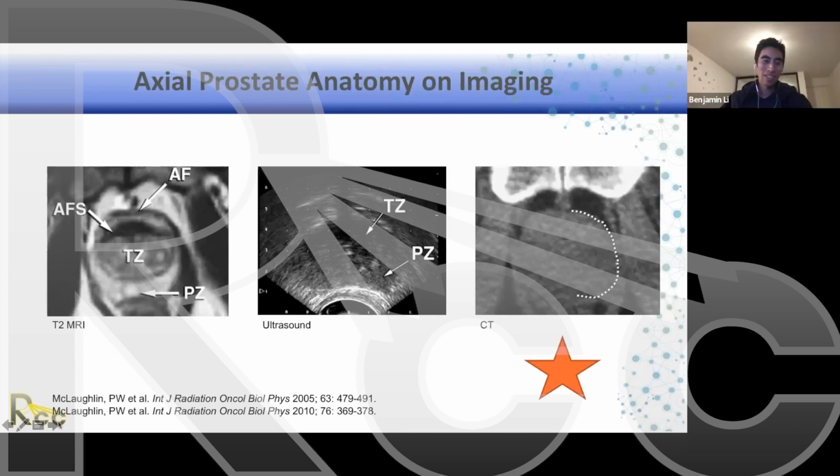Sure. And actually on this slide, one thing I want to call out, because I actually made this mistake. Getting the MRI, I thought, oh, great, I can see the prostate perfectly. Here it is, here's the prostate. And I didn't realize that the peripheral zone should be included, but it looks a very different color, and you can mistake it for fat.